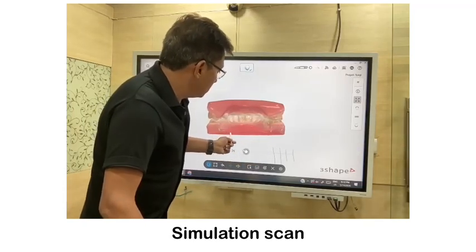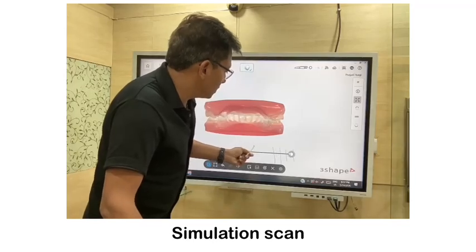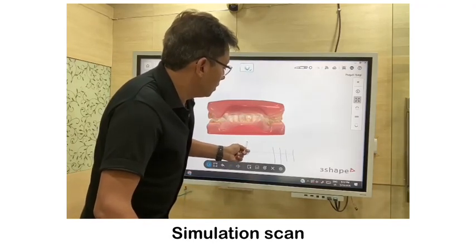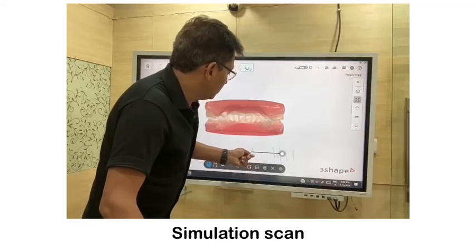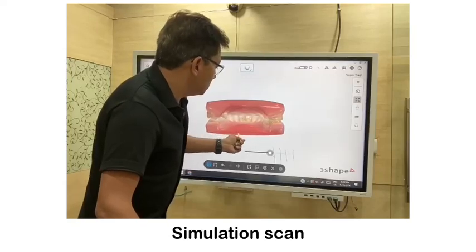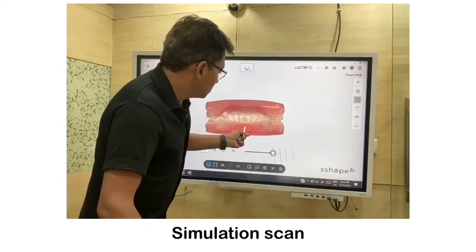So the current state is this, it must have started from here, hit slide, hit slide, hit slide, and as we say, now the full envelope of movement is this much. When the movement is this much, the breakage is more, the wear is more. So once we reach this and we create the occlusal locks somewhere around here, the slide will be only this much.